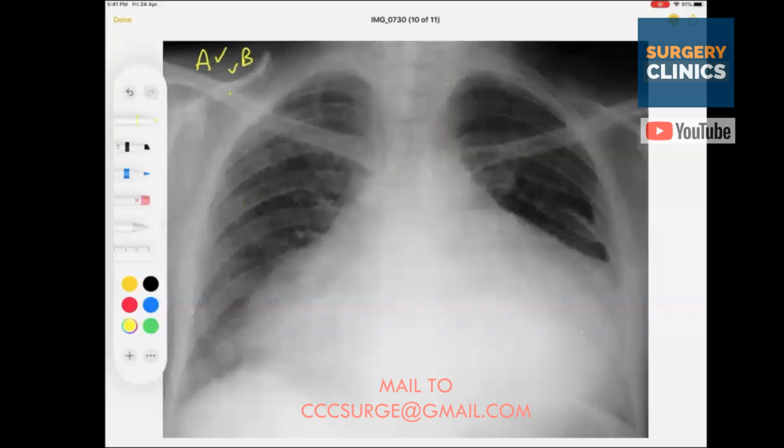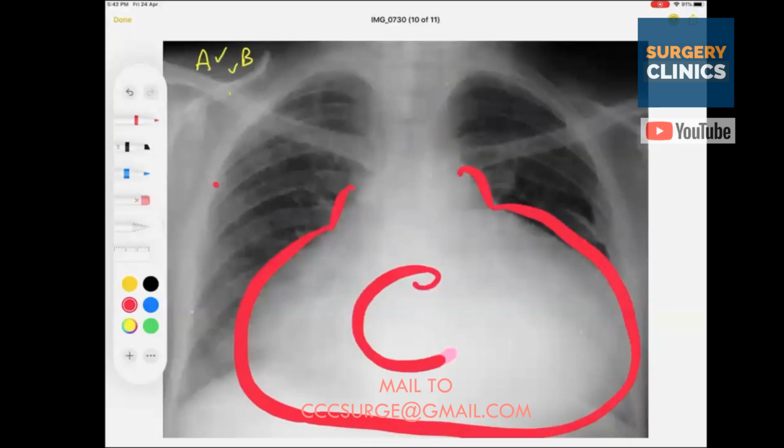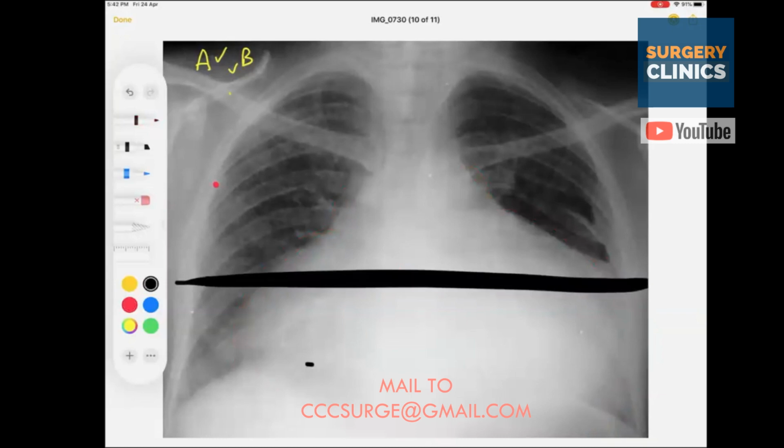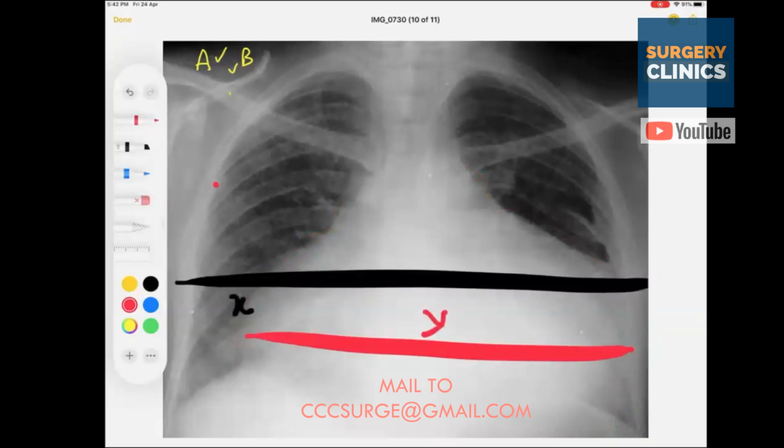Let us talk about the C then, guys. If you have talked about the C, wow, man, he's a big heart. And now the C, tell me, what is the biggest problem in this C? Now, can you see that if the maximum diameter is X, what is this diameter? Wow, this is Y. And Y definitely is greater than half of X.